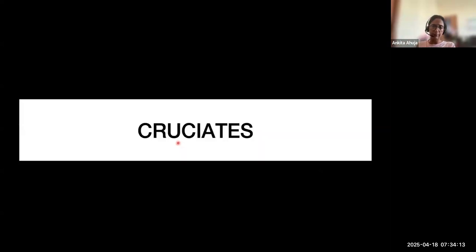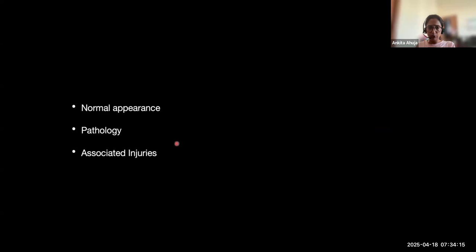So to conclude meniscus, what is most important is to identify what the meniscal tear is. You would have some variants which I could not cover over here. So if you pick up a variant, you should not confuse it with a tear. But overall, what is most important is that you know the ultrastructure, you know which tear it is and what complication it is resulting in. From there, we move on to the cruciates.